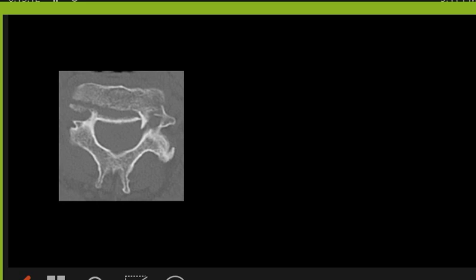Okay, and the patient may die from this fracture. What is the cause of death in this fracture? Vertebral artery ischemia. Yes, but what is the cause of death? Spinal cord rupture? No. It is some sort of hyperextension, but what is the cause of death? It is asphyxia. Asphyxia is the cause of death of the hangman fracture, okay?